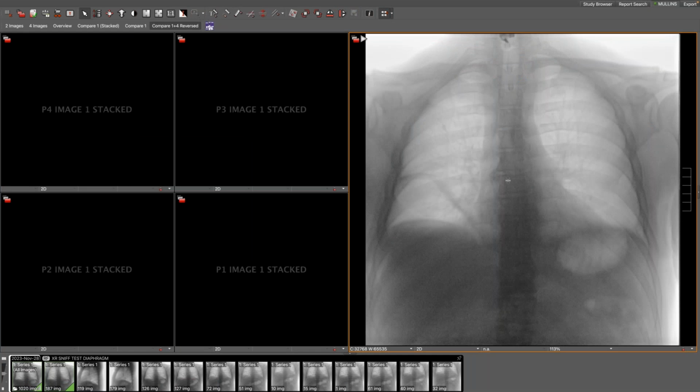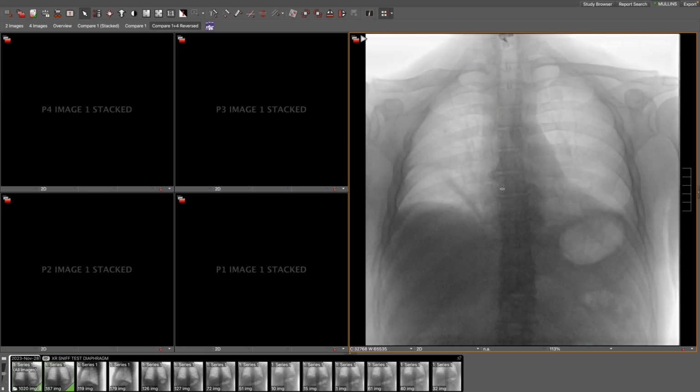Can you see a fluoroscopic image here that's moving? Yes. Okay. So this is this fellow who's middle-aged. He's a robust guy, middle-aged. He's very short of breath. He is unable to sleep flat. And this all follows an injury that he had in June of 2023, where he had whiplash. He'd already had a cervical spine fusion at the point that he had this whiplash injury.